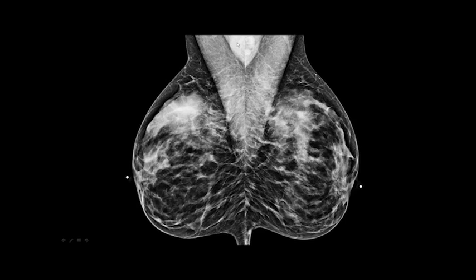So the muscle on both sides is wide superiorly with the convex border down to the level of the nipple. The parenchymal patterns are horizontal. The IMFs are clearly on there. There are no folds in the IMF. The nipples are in profile. And these are just absolutely perfect images for accreditation purposes for dense breast. You can't get any prettier than that. There are a few little wrinkles here, but they aren't going to mark you off for that.